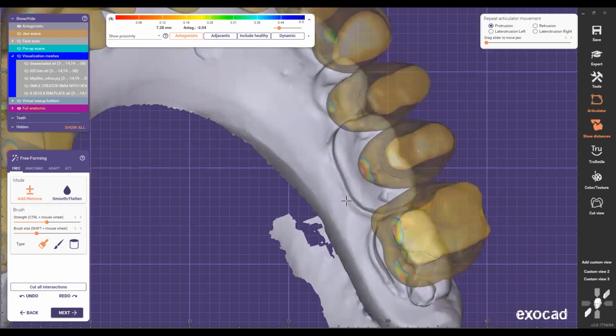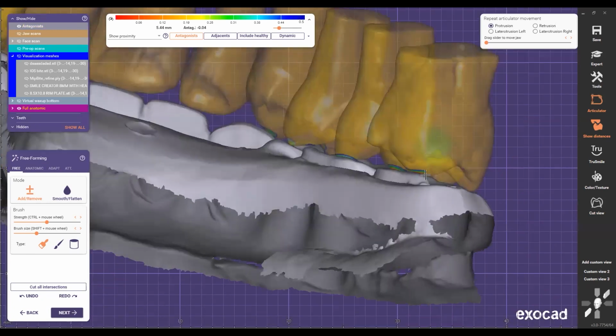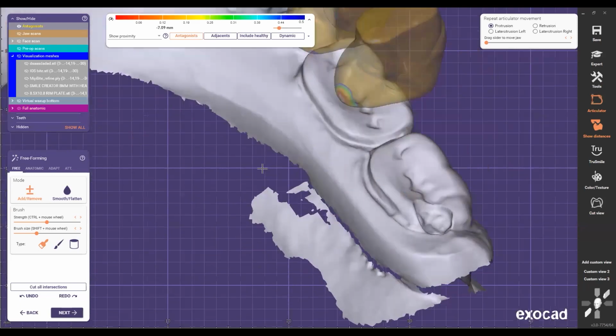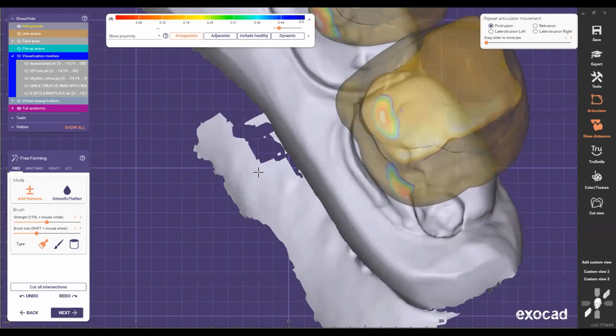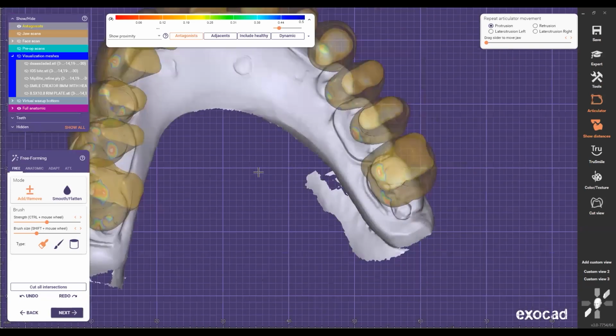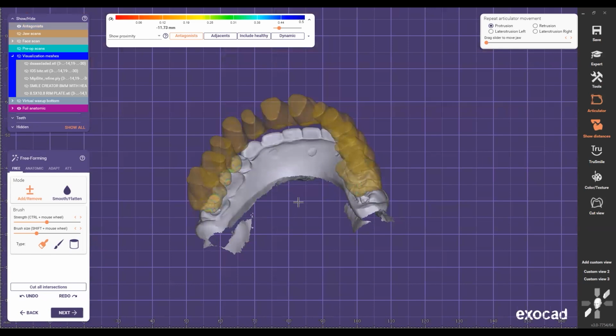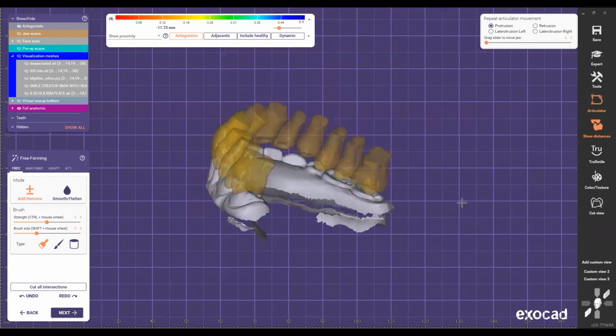One thing I can tell the doctor, if I want to leave an ideal design right there, is, hey doc, just trim that tooth more. Okay, so I still have those options. And that's why when you understand this, you educate the doctor at the same time, so they know what to expect when they're going to deliver these cases.